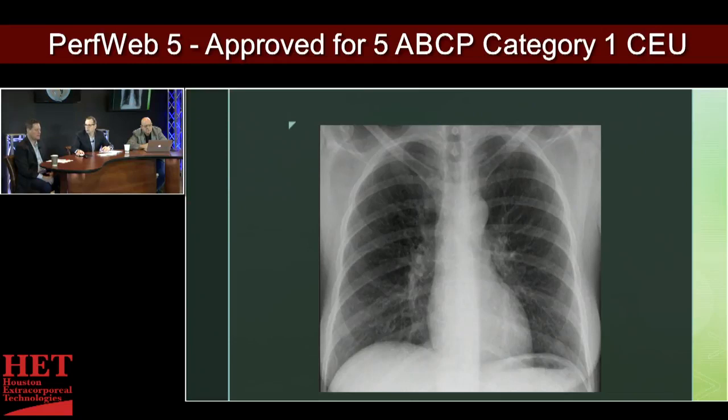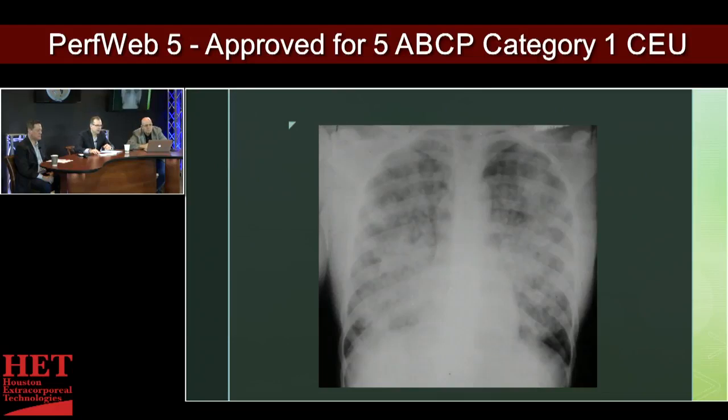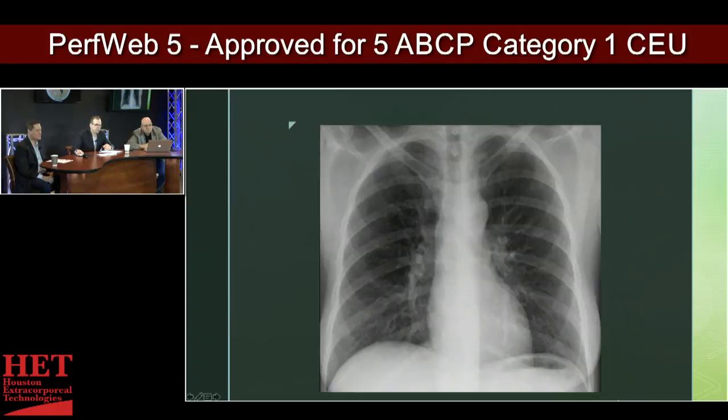If they tell you they've been retching and vomiting, and their x-ray starts to look like this, and they also have that air fluid level, you're going to start thinking they will develop a chemical pneumonitis, because like we mentioned earlier, the chest x-ray will often lag behind the clinical picture. So if they continue to deteriorate from a respiratory standpoint, you may want to initiate VV ECMO earlier rather than later because you know the process that's developing.